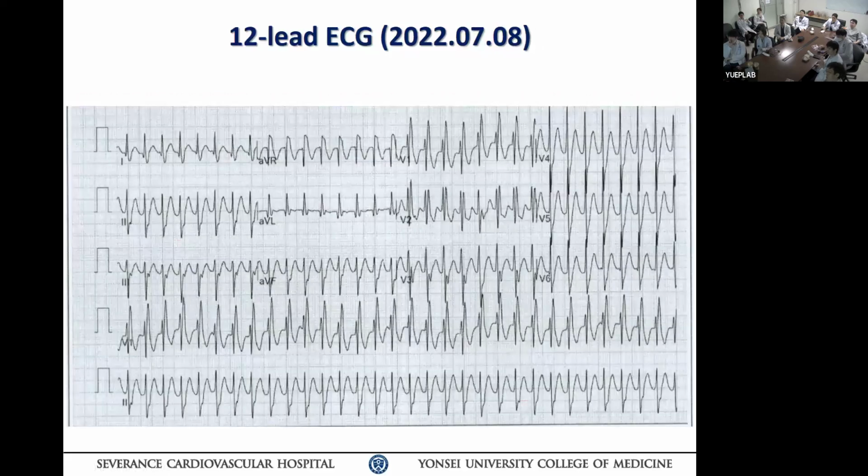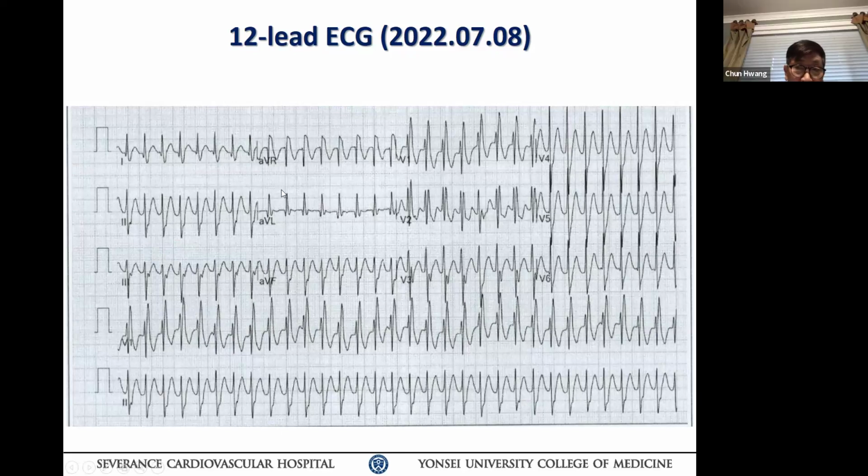All right. 그래서 요게 그 12월 어블레이션 전에 있는 가장 예전에 EKG고요. Now, 액시스랑 now it's not making sense, though. 그러니까 확실히 QRS 컴플렉스 V2에도 보면 number 1, 2, 3, 4, 5 비트 완전 QRS가 퓨전돼 있죠.